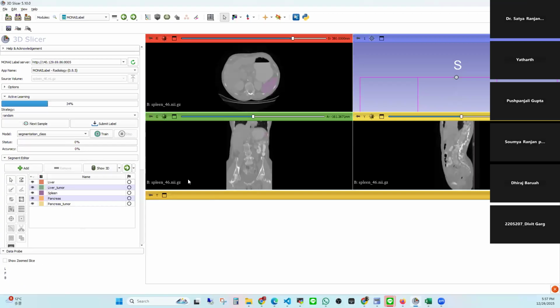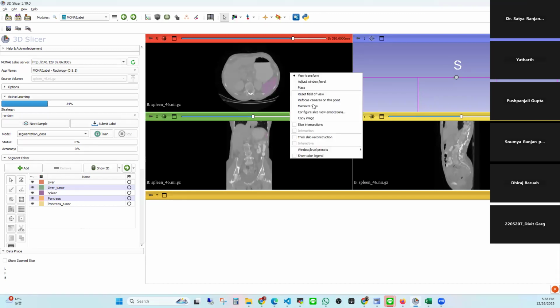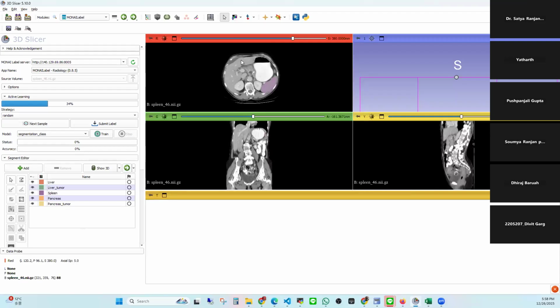And the one I was showing in the video, I'll show now again. It seems like this is one image, for the spleen. Because we are working on the abdomen, it's better to see in the abdomen view. So I just switch to the abdomen view, and you can see now the organs are quite clear in comparison to the previous view. This is the liver, and the annotation for the liver we will make. And this is the kidney, and this is the spine.